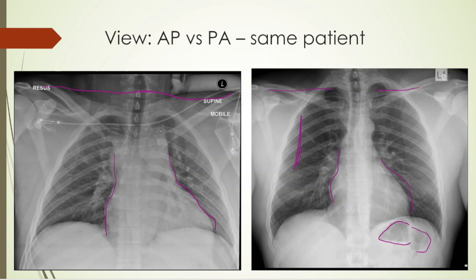Again, the mediastinum looks large here. You might freak out and go, oh my God, but it's really due to the type of film and how the picture's taken, AP versus PA.